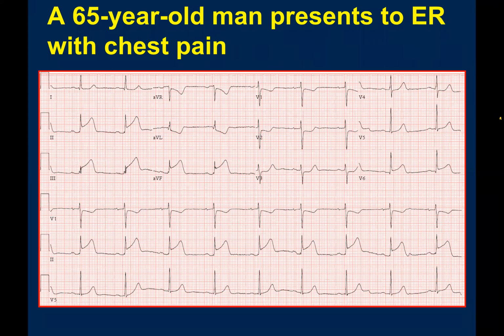So if there is infarction, because the right coronary supplies the inferior wall, the posterior wall and the RV, if there is infarction in the posterior wall with the inferior, how will you see it in the 12-lead ECG? It will be shown as depression in the anterior leads. V1, V2 would be depression because it is a mirror image. We are looking anteriorly and the infarction is posterior.